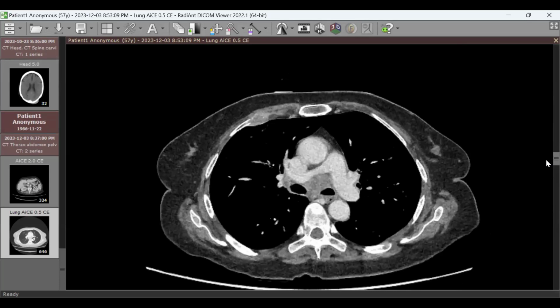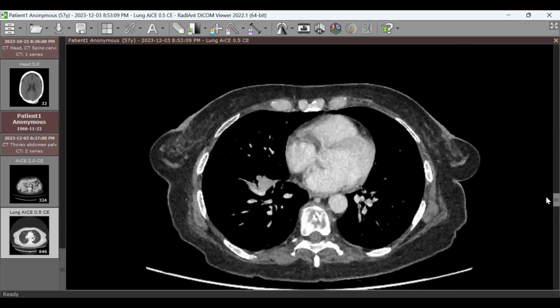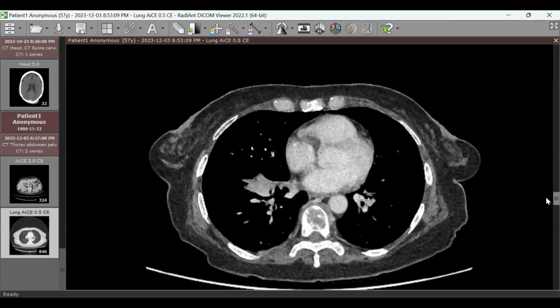We'll come to that. But when we see metastasis, we look for the primary, right? And vice versa. So first, I want you to tell me where is the primary, and then we can talk about this later. Here's a right lower lobe central bronchogenic mass, obliterating and narrowing the bronchus. Good. So we suspect that this is the primary tumor here, right?